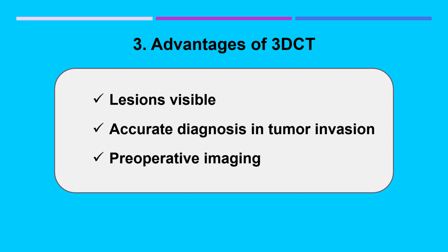Three-dimensional CT, or 3D CT, adds great diagnostic value. It visualizes tumor invasion and stomach morphology intuitively. It also provides virtual endoscopic views, helping surgeons understand the spatial relationships between the tumor and the nearby organs. In short, 3D CT improves diagnostic confidence and preoperative planning.